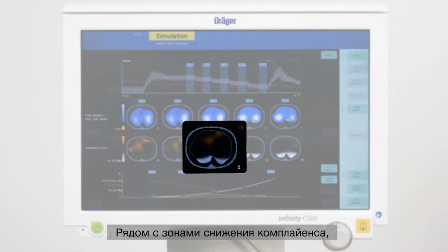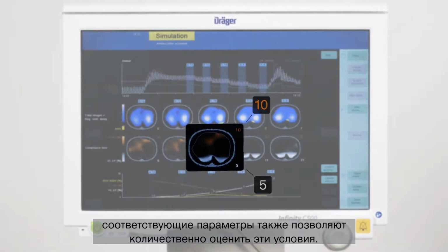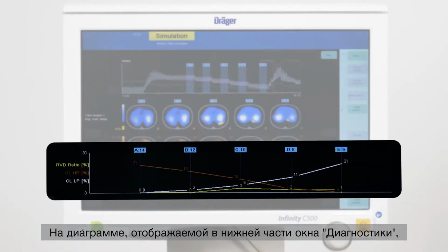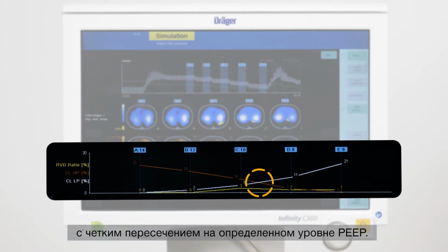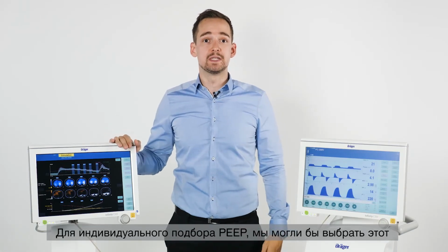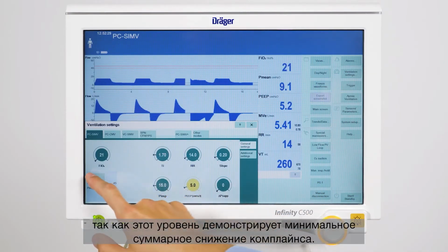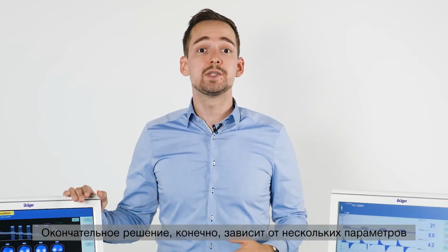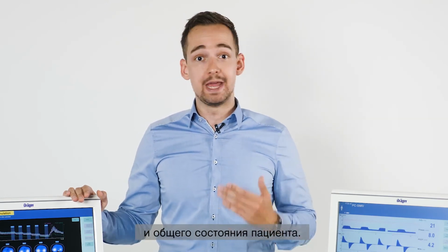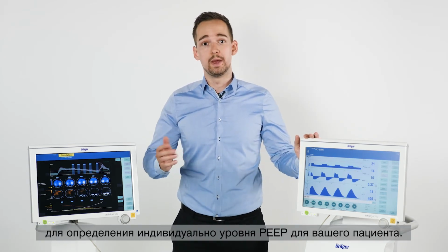Next to the maps of compliance loss, the associated parameters also allow a quantification of those conditions. In the diagram, which is displayed at the bottom of this diagnostic view, we can observe an opposing trend of collapse and overdistension with a clear intersection at a certain PEEP level. To personalize PEEP selection, we could choose this or the next higher PEEP level, as this level shows the minimal amount of total compliance loss. The final decision, of course, depends on multiple parameters and the overall patient condition. So this is one possible workflow on how to find the individual PEEP for your patient.